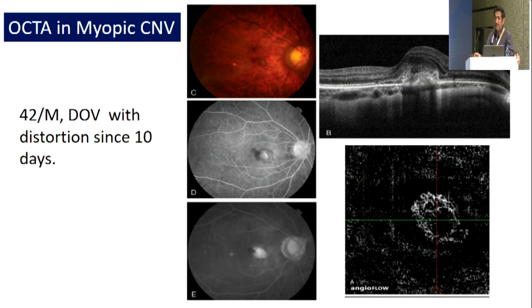In myopic CNVM also it's very important. 5 to 10% of the patients with pathological myopia can lose vision because of myopic CNVM. The subretinal heme that you see could be because of a new lacquer crack. There could be no CNVM, in which case injection is not required. Or it could be because of a CNVM formation that you see here.